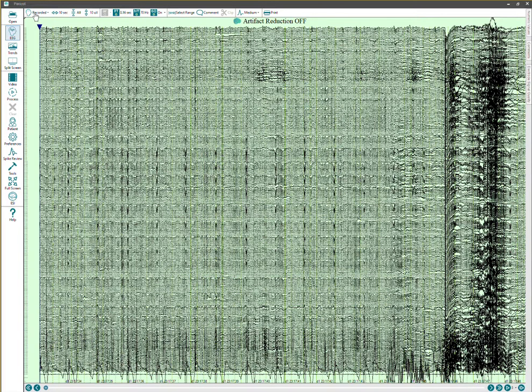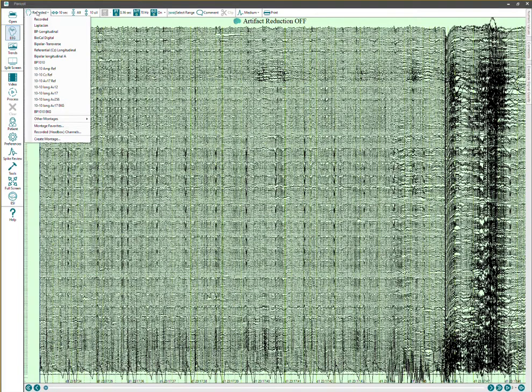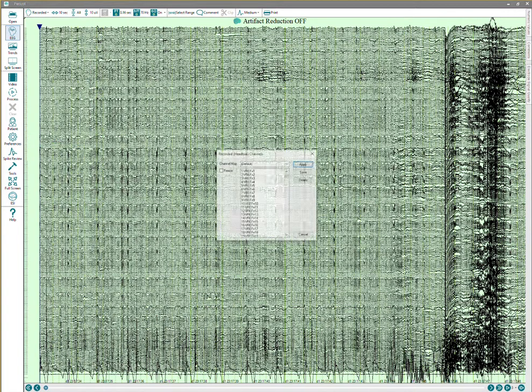I've already opened up a recording, and I'm going to note that I've selected the recorded montage. And if I go to the recorded headbox channels, this one's set to default. And so channels 1 through 259, although there aren't 259 channels in this recording, which is interesting, as the label goes 256, 258, 259, so 257 has been skipped. Just one interesting thing, but these are just labels again, so that's actually channel 258 because that's what it says after the equal sign there.